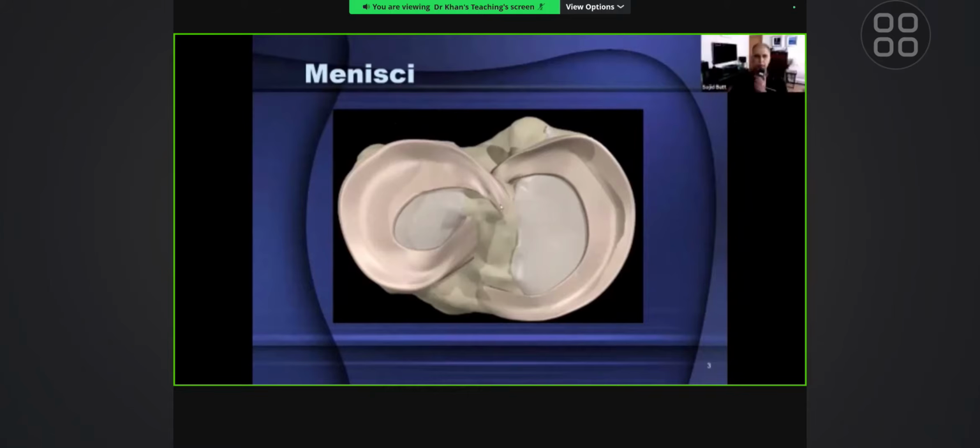So we've got the rounded lateral meniscus, and we've got the more lazy curved medial meniscus. These menisci are made of fibrocartilage, and fibrocartilage in the body is distributed in terms of fibrocartilaginous discs, like the disc you get in the symphysis pubis, in the acromioclavicular joint, at the annular margins of the discs, annulus fibrosus.